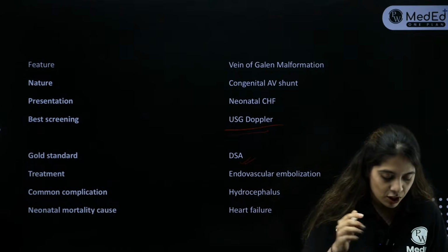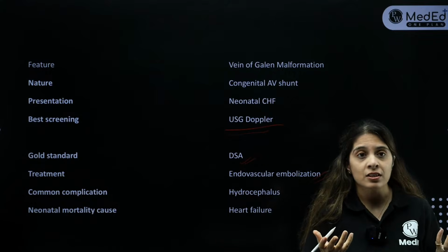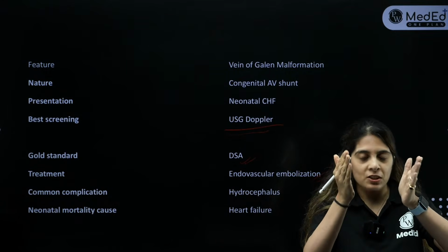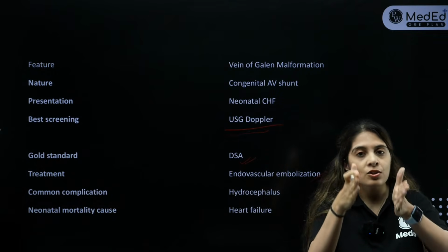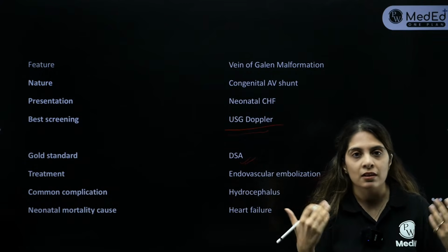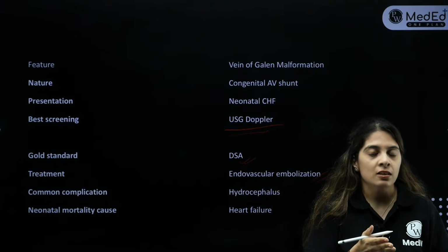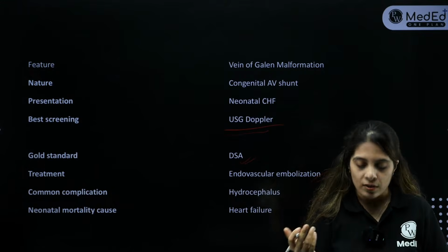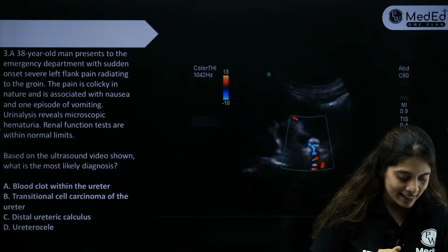What will be the treatment? The treatment is endovascular embolization. Common complication: why hydrocephalus? Because of the obstruction. Because something so large is present in the region posterior to the third ventricle, it is going to compress the aqueduct, and because of this it will lead to an obstructive hydrocephalus. So that is a very important complication. As we have seen in this question, the baby was presenting with hydrocephalus, and neonatal mortality causes heart failure, right? Okay, so let's move towards our next MCQ.